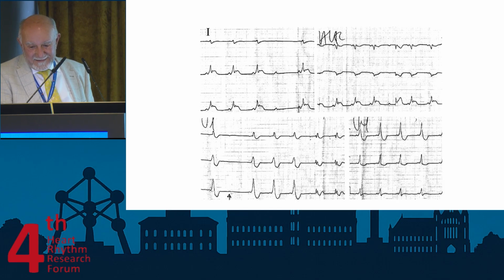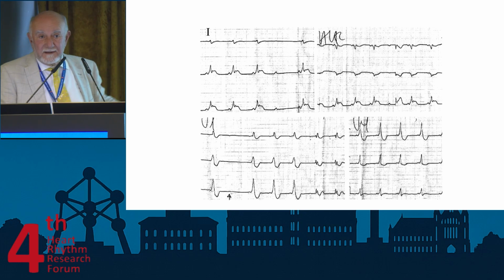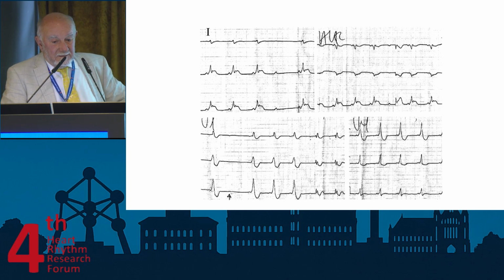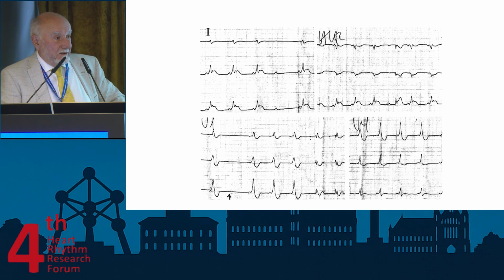You have a P wave and a ventricle there with short PR. There is an arrow showing you a P wave that is blocked also, for clarity, because the P wave was very small. So AV block during MI, it is also. There is an AV block. It cannot be idioventricular rhythm.